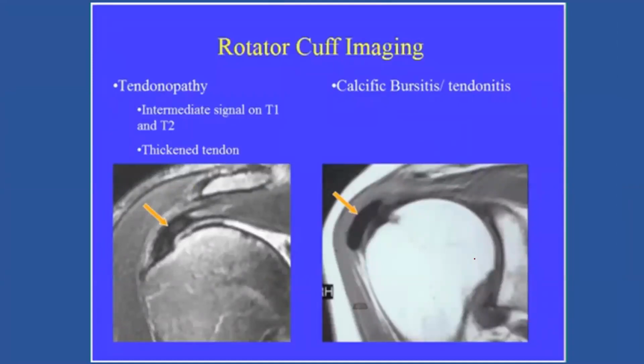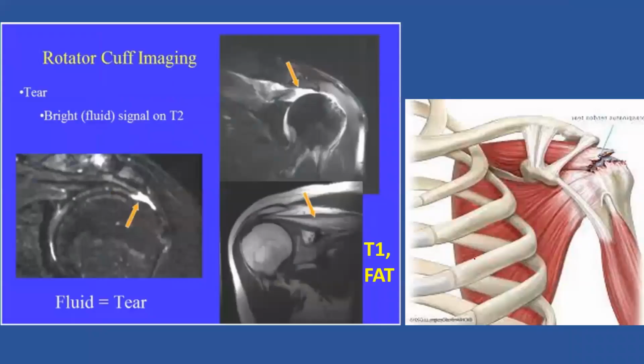This shows you a tendinopathy, but on the left side, okay? But on the right side, you should distinguish it from calcification. A calcific bursitis appears dark completely. There are no white streaks, as we see on the left side. This is how we distinguish between the two. Calcification is dark throughout. On the left side, we see streaks. Don't forget this.